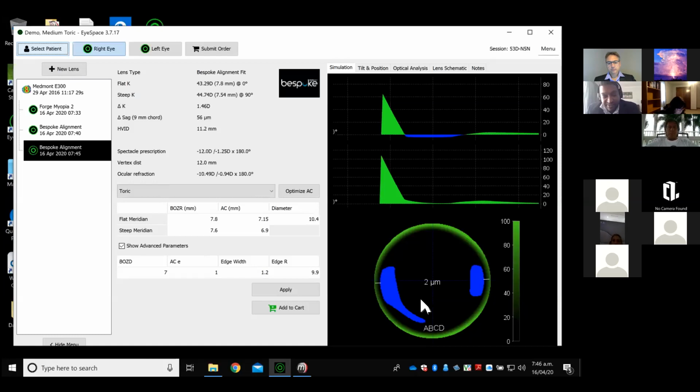That's one of the times when I've been really grateful to have access to things like an OCT, to make sure that I definitely have clearance, especially with some of my proud cones for keratoconus and very high astigmats. So that's how I personally fit. In this case, where it's 2 microns, I'd probably prefer it to be closer to 10. But that's just my personal preference there.